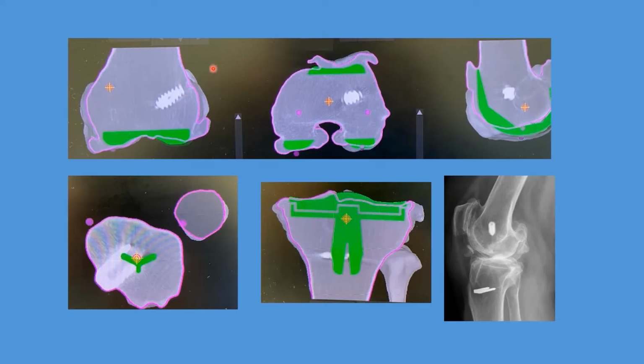So once again, the CT images are invaluable. You can see there's such an extensive amount of deformity around this knee. These are osteophytes, bone spurs everywhere, which are distorting the natural anatomy of the knee. So one benefit is that we can actually see what the implant will look like by visually removing the deformity around the knee. But the second thing that we'll do is we'll actually look at the position of the hardware, the screw and the staple in relation to the implants.